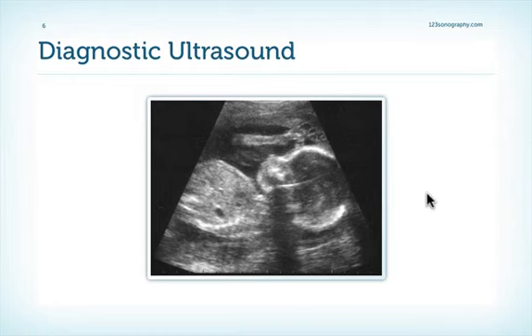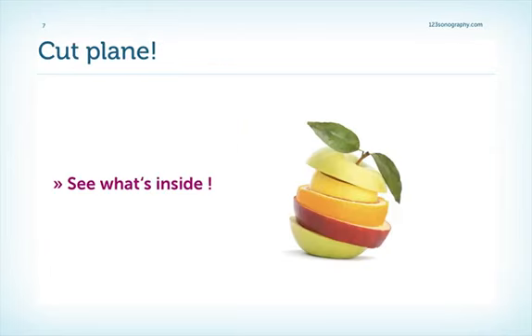Do you all recognize what this is? Well, obviously this is not a heart, but it's a fetus. But the same principles apply to all types of ultrasound, no matter where you use it.